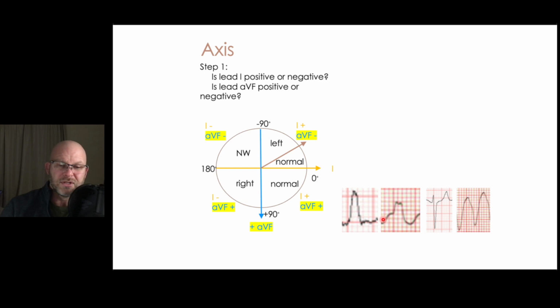But these first two on the left are clearly up. This first one's definitely clearly up. The second one, you could make an argument either way, but more of the activity is on this upward stroke. On these last two, the third one in line here is clearly more below the isoelectric line, and this wider rhythm here is sharper on the bottom. So the first two are pointed up, the second two are pointed down. So that's what we're talking about.